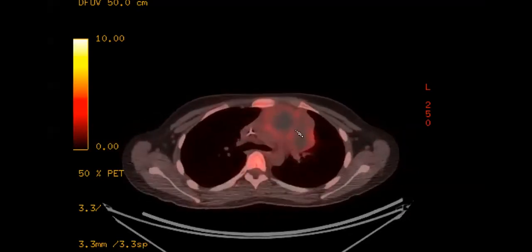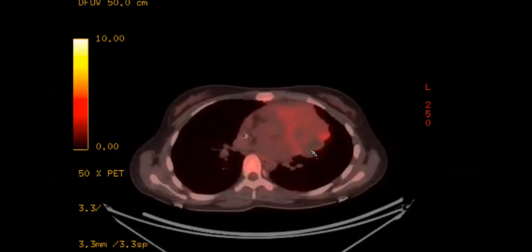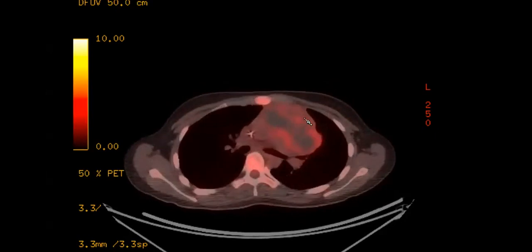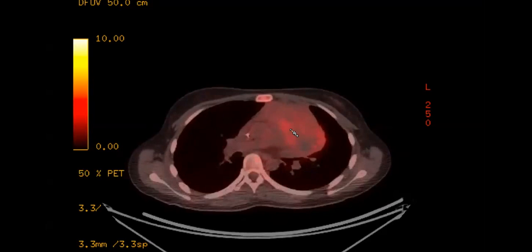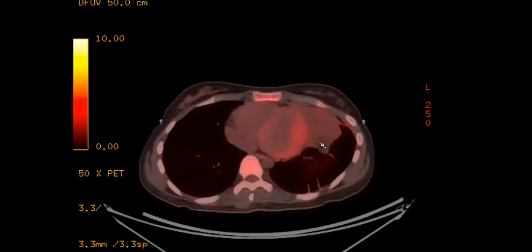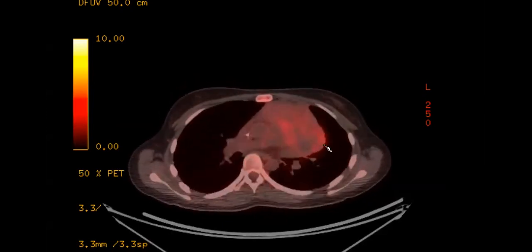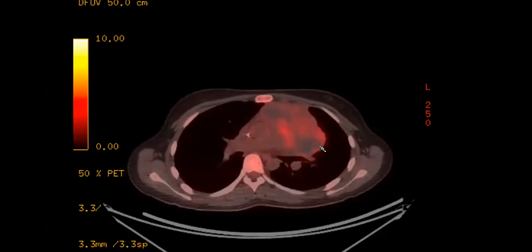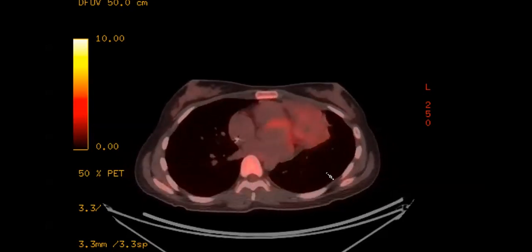But anyway, now you see actually after 2 months of chemotherapy, it's shrunk significantly, and there's just a little bit of FDG avidity along the periphery. So doing much, much better. Didn't need to resect it. It was really involving the heart. So it's beautifully shrinking away. And in younger patients, more frequently Hodgkin's lymphoma. This one is in a slightly older patient, it's a B-cell lymphoma. Okay, that's all I have.